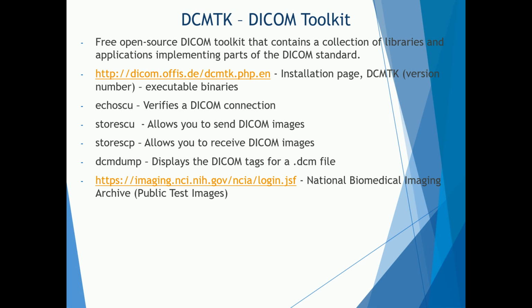So typical functions, if you will. We're going to go through all of these examples, and then go through more in these training videos. First, I want to show you how to get the DICOM toolkit, and where you're going to go to actually download the file.